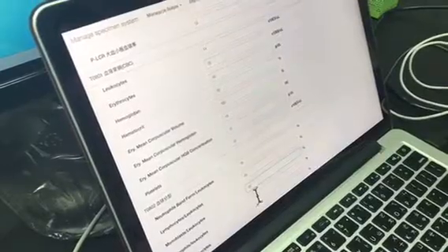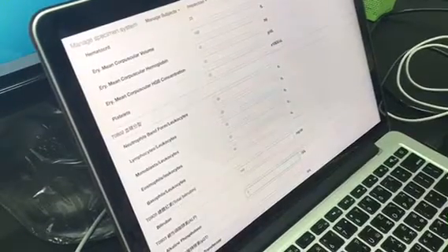So you can design what kind of data element and also the data type you are going to enter, and you can also set up the reference range. So this is just an example of how you can enter the data.